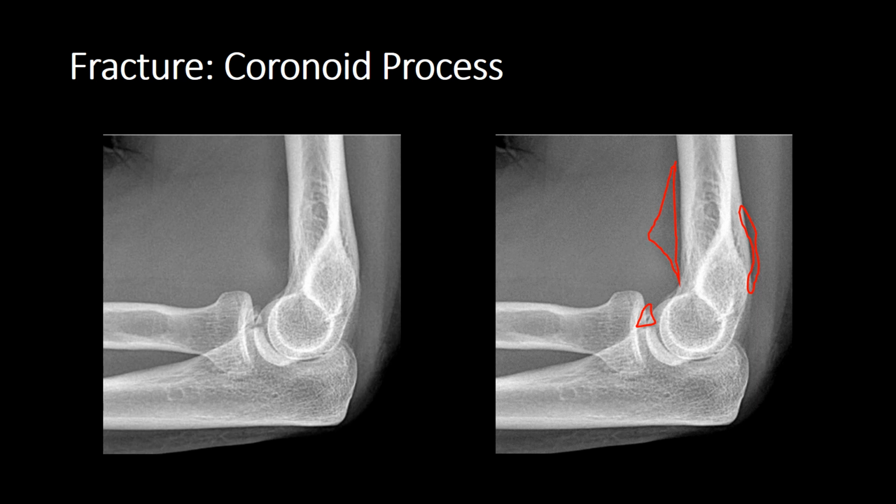As always, the soft tissue structures will alert us to the fact that there is an underlying intracapsular injury, and we can see quite clearly that there is an elbow joint effusion with a sail sign of the anterior fat pad and evidence of the posterior fat pad posteriorly.